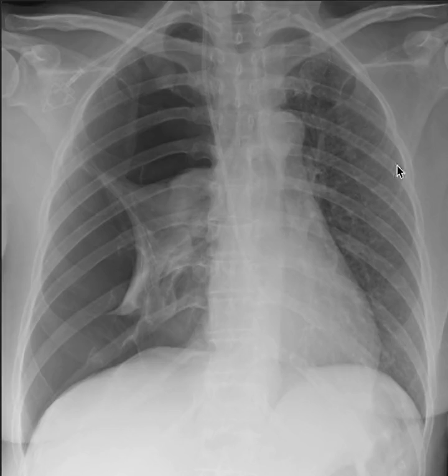There is nothing that jumps out on this left side. This is relatively normal. All right, now let's compare this to the patient's right side. Let's focus our attention here. Now, even if you didn't know exactly what was going on here, this should at least just jump out at you and strike you as very abnormal.